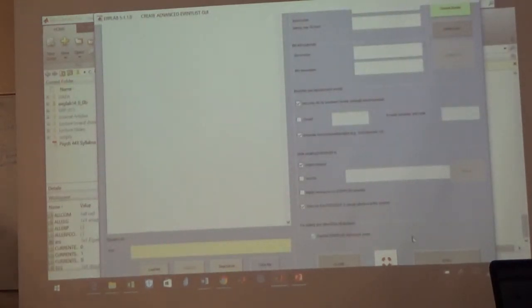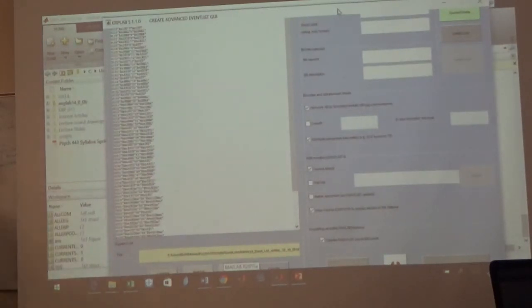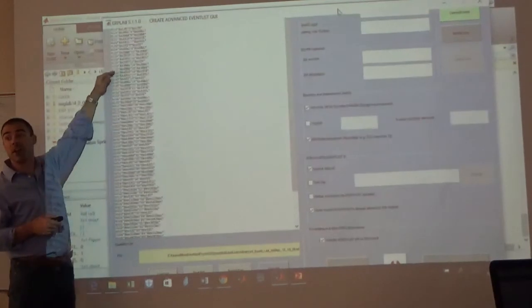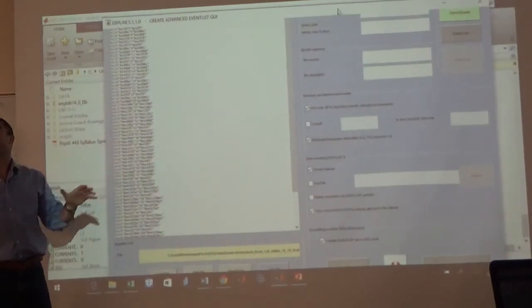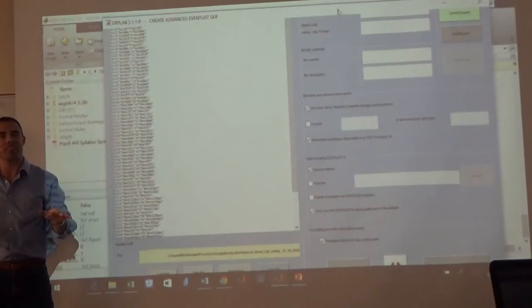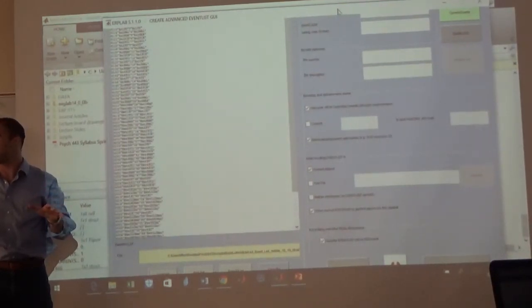Now what that will do is populate a bunch of stuff. Notice that you'll have 75 rows. So I was going to have you guys write all that out. But I said, you know what? I'm going to hook them up. I'll write these 75 fun rows out.